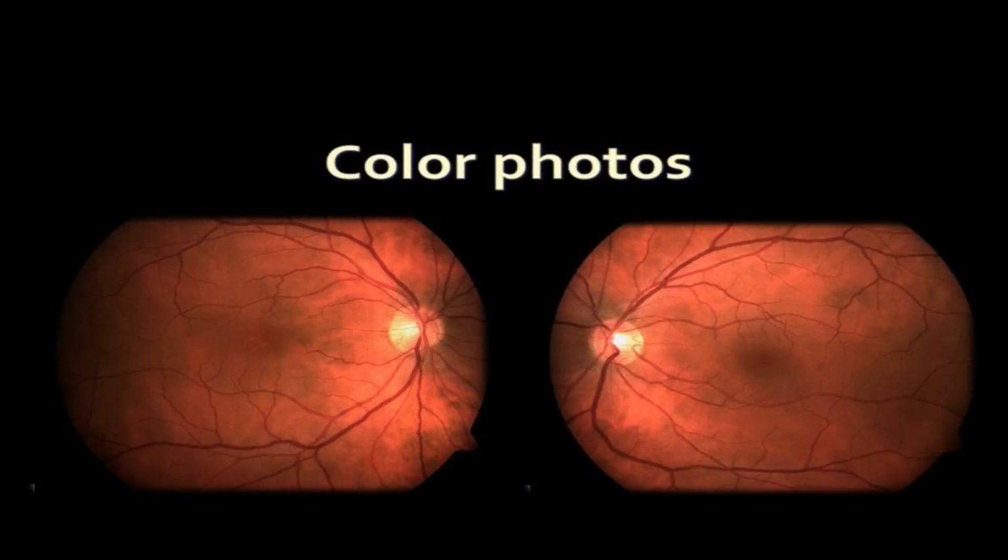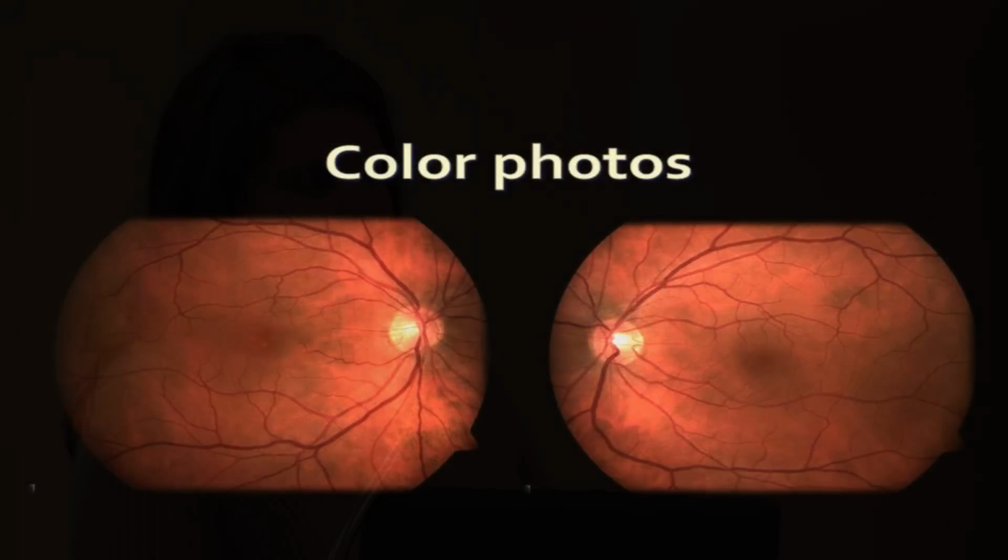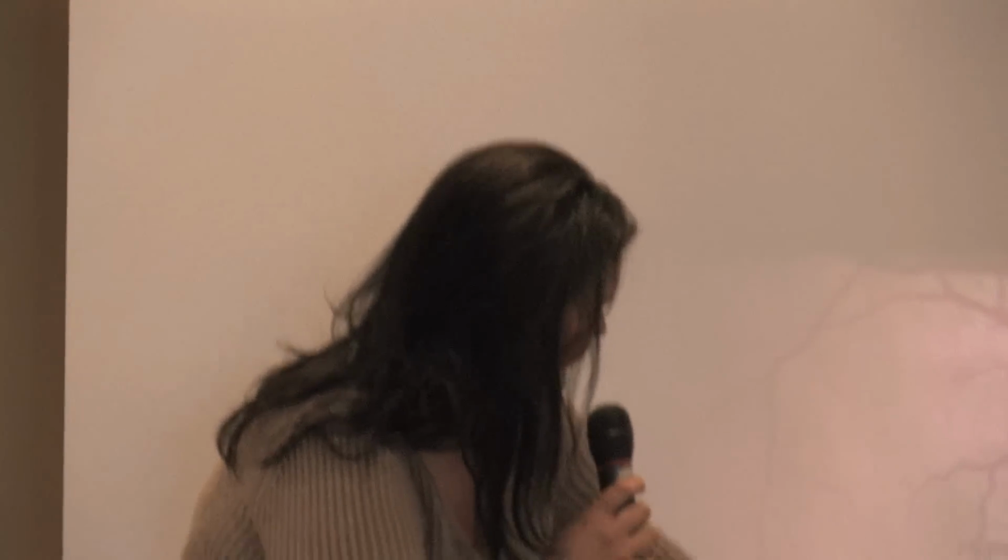These are color photos of the right eye and left eye. Keep in mind that these are just color photos. The area that we're scanning when we do the OCT is the macula and the fovea.